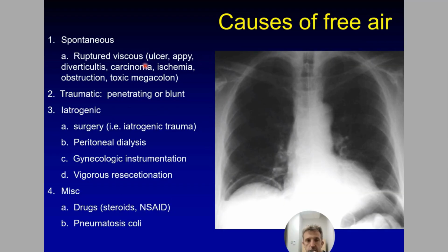Don't miss that! So causes of free air, you always worry about a ruptured viscus. Trauma patient. This was actually a post-surgical patient. This was an expected finding.